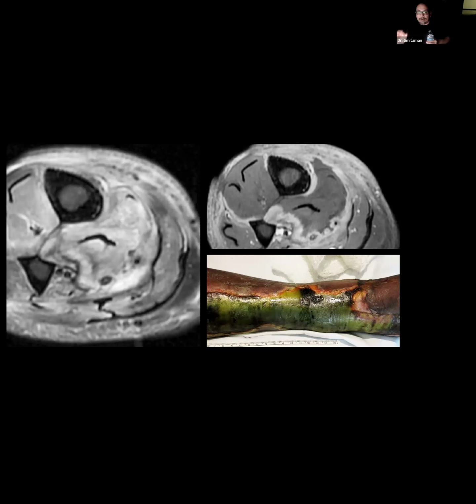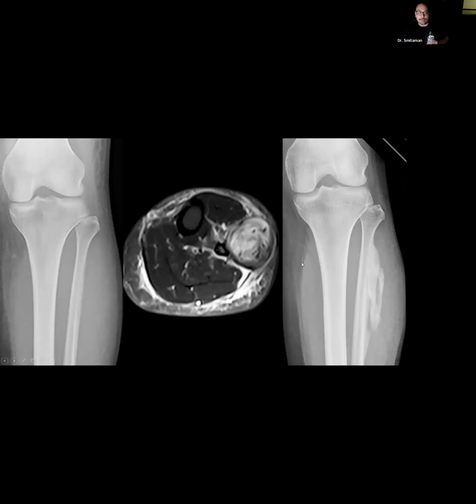Imaging is not the primary tool for diagnosis, but if you happen to image it, this is what it's going to look like. What you're going to be listening for are those 4 or 5 P's, if you remember from medical school, right? So you're going to listen for pain, paresthesia, pallor, pulselessness, and I probably forget another P, but we could probably make one up, okay? But these, when present, prompt immediate surgical intervention. So this is a case of acute compartment syndrome.